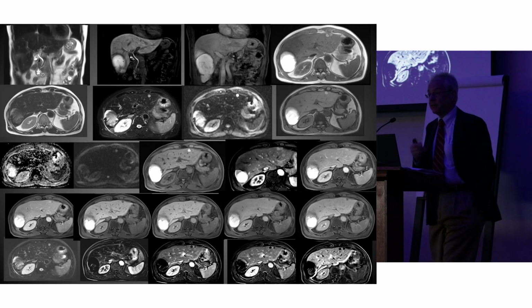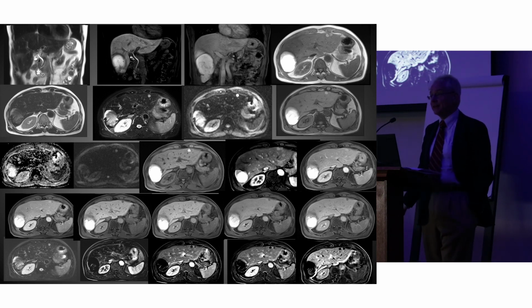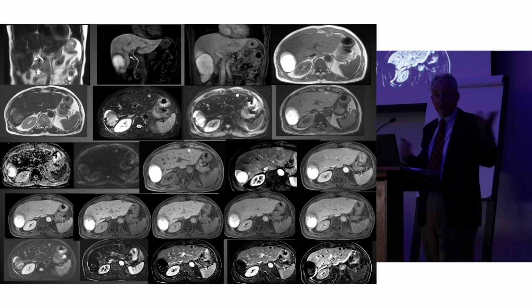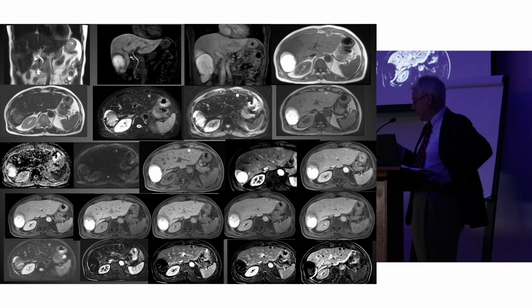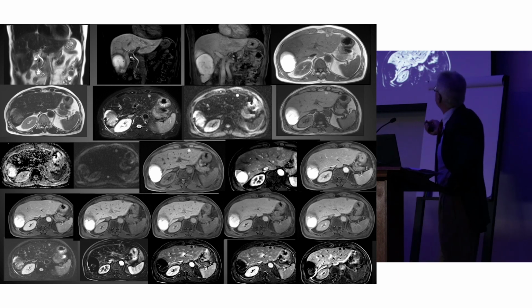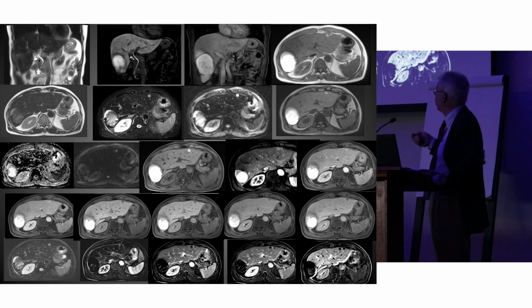This is, again, a slide that Patrick made a couple years ago, but why does an MRI take so long to get? Well, because they do all these different sequences of how they're throwing the magnetic pulses at our bodies to produce these incredibly powerful images. This is the same patient, same level of the body, just going through all the different series that were obtained.